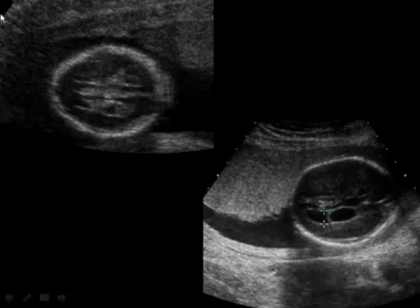So here are 2 different patients with choroid plexus cysts. This is much earlier in gestation, and there's the round, black, discrete structure completely within the echogenic choroid plexus in this fetus with trisomy 18. Here's a different fetus. The choroid plexus cyst is much larger. Indeed, it almost replaces the entire choroid. This fetus had normal chromosomes.